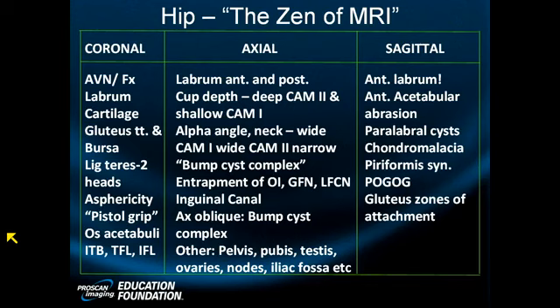But when you have diaphyseal disease, you're able to seriously narrow your differential diagnosis. So for you registrars out there, diaphysis, this is one condition you would consider. In fact, you'd make the diagnosis in this case, making sure nobody did something stupid like biopsy it, or do a bone scan, or draw some bloods, come up with the correct answer. But for general diaphyseal disease, you think primary lymphoma, Ewing's, osteomyelitis. We'll stop right there.